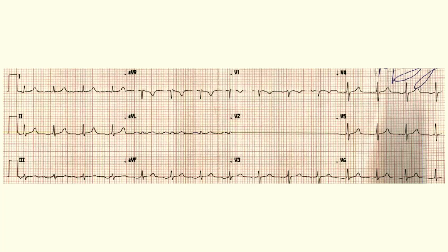So on this guy, what do we have? Lead 2, they're upside down. Lead AVF, they're upside down. Kind of flatten some of the other leads. This is some kind of low atrial rhythm. Now, it has a 1-to-1 conduction. There's some ectopic focus somewhere, maybe near the coronary sinus or something low in the atrium. But this is not sinus rhythm, even though there's 1-to-1 AV conduction.